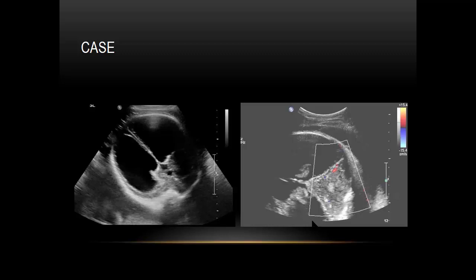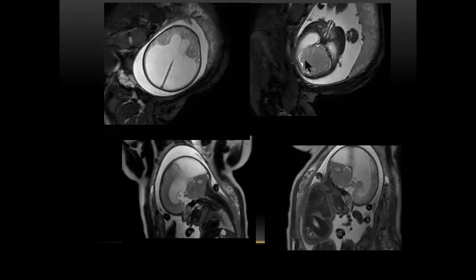This is a beautiful case which illustrates why MRI is helpful. This patient came in with hydrocephalus, we didn't really know the reason why, and was referred from outside. We thought maybe there's something in the posterior fossa, because this looked very heterogeneous. Did an MRI, and lo and behold, we found a posterior fossa teratoma, because this is a large mass in the posterior fossa, very irregular, had some areas of hemorrhage. There was compression or downward pulling of this mass into the spinal canal as well, and we gave that information to the pediatricians. So this was a posterior fossa teratoma.